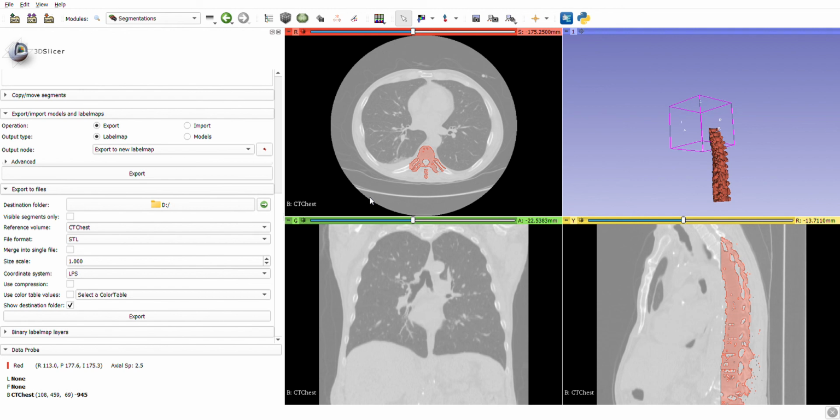This entire process I have explained: the input was a 2D DICOM file, and the output, as you can see over here, is a 3D model. Then further we can fabricate, or make this physical model of this 3D body part by using different technologies.